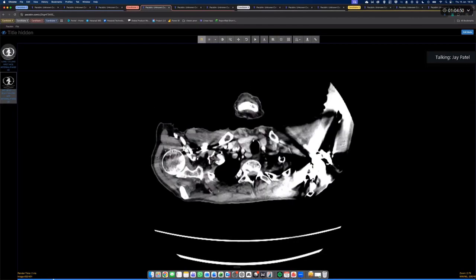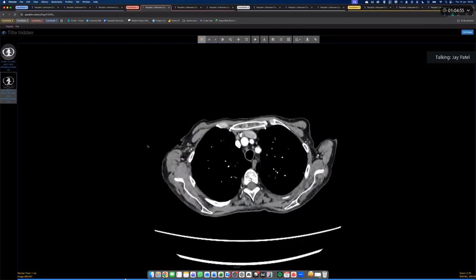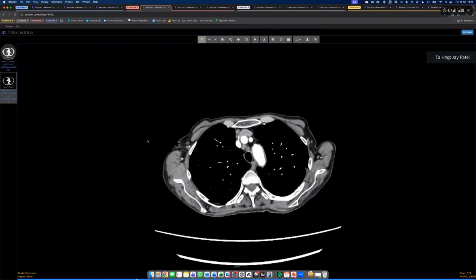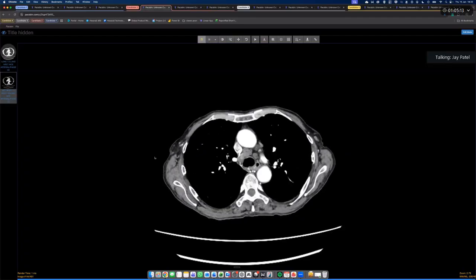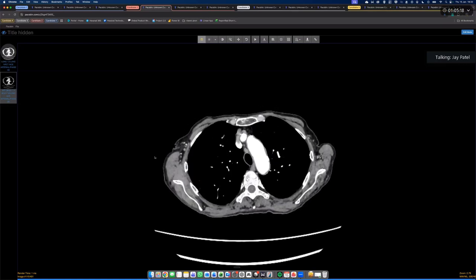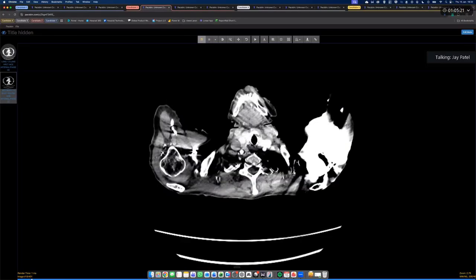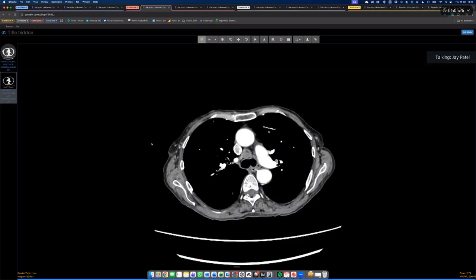I like the way that you started explaining what you were looking at. Worth not repeating exactly what I have said. In this scenario, this is a patient who's had a chest CT as a result of an abnormal chest X-ray, and I think you said the same thing. Just keep it nice and brief. Your introduction can be quite quick. It is an axial CT examination through the thorax in an arterial phase. That's all you need to say.